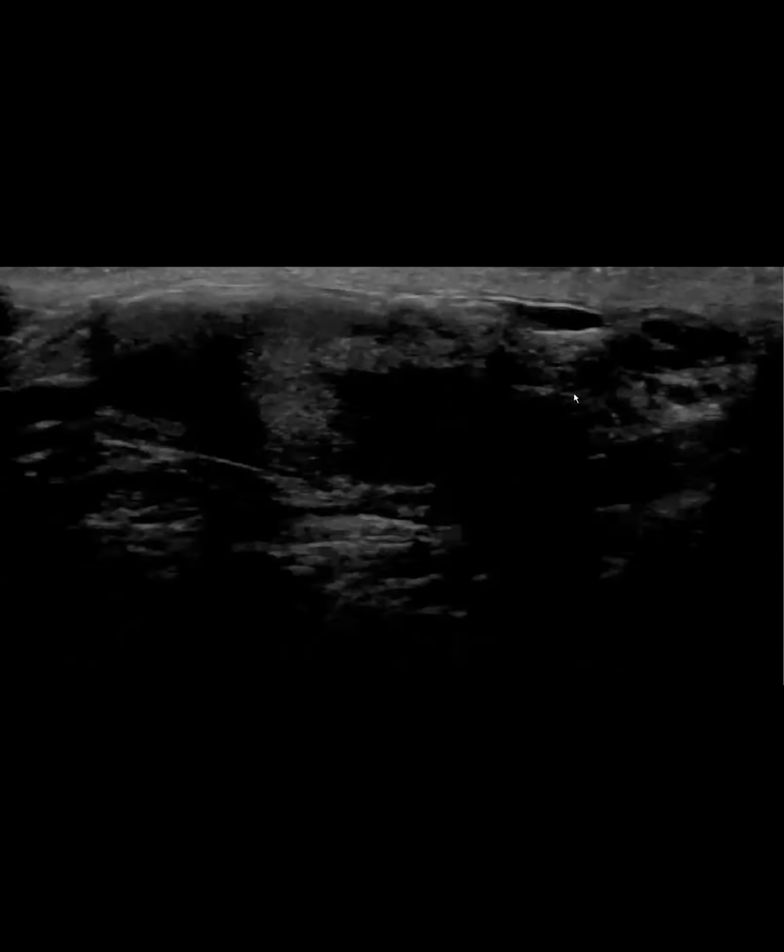Wow, that's amazing. So wait, you said that the chest and pelvis were negative, and so just to be complete, they went and did the scrotal ultrasound. They didn't, because this seems like it wouldn't even be palpable. Exactly. So they were really just fishing for anything at that point. It's amazing. But it was a hard call because it didn't have a typical appearance of a germ cell tumor, I would say. I mean, it just looks like the borders are kind of funky. But I guess it could be, he didn't have anything else going on.